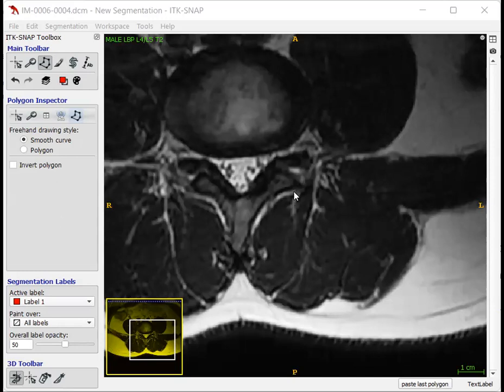We can see the multifidus muscle is right around here. We're going to use our borders to go through the segmentation. We want to include this little strip of fat right along the spinous process and lamina, and we are going to come all the way down to the posterior border. Then we're going to use this little white line here. This is actually that line of fat that separates our multifidus muscle from the erector spinae group.